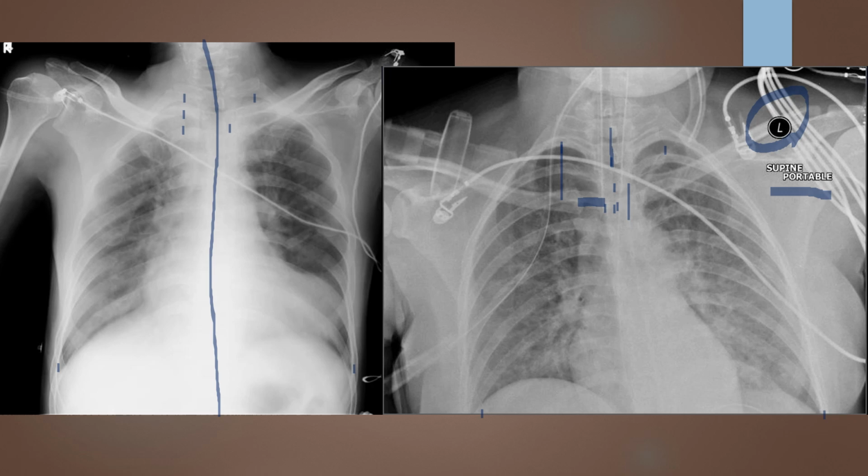The next thing I'm going to look at is my mid-sagittal rotation, which we already evaluated, so we can jump right into our mid-sagittal tilt. The patient is, as you can see, not in alignment with the image receptor, so they are slightly tilted.